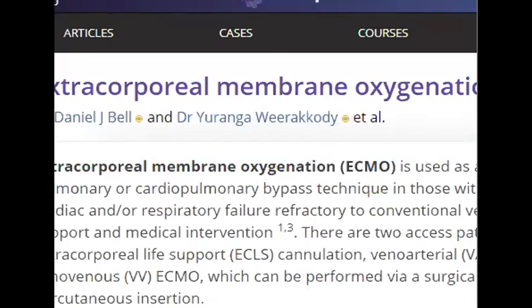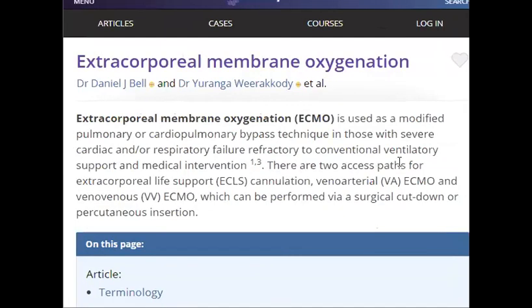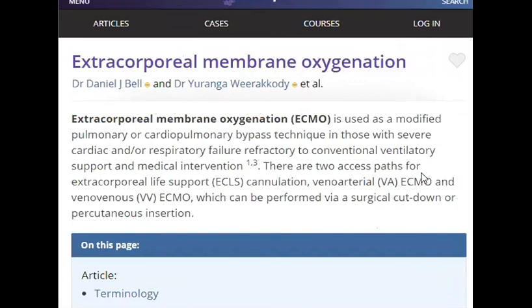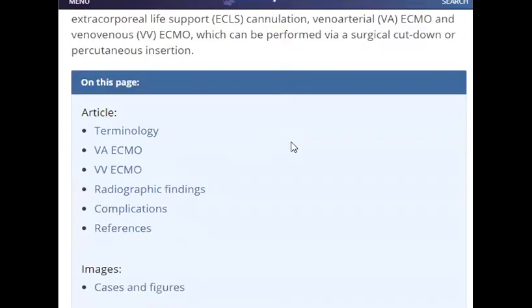Let's have a look, because its importance now is maybe much more. Do you know why, where it is used? Cardiorespiratory failure. Yeah, and especially they like to use it now with COVID-19 patients. So just to know about it and how it looks.